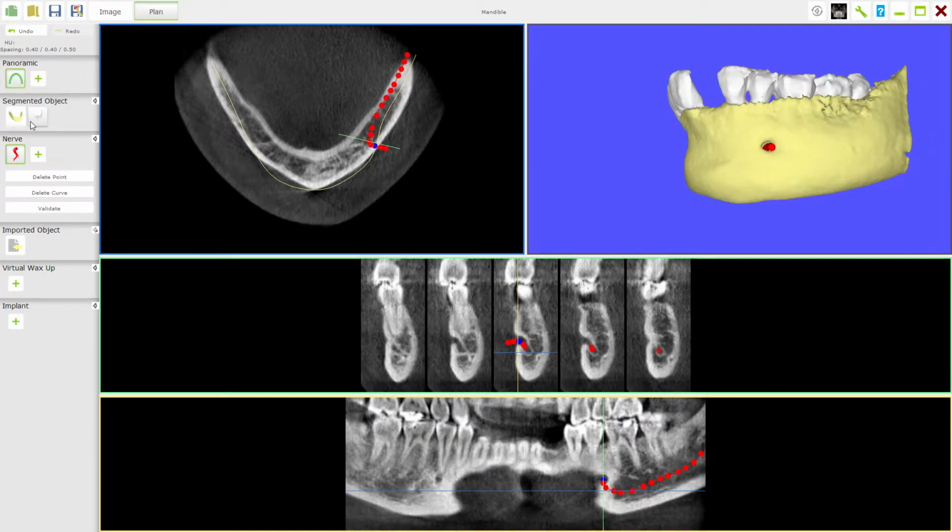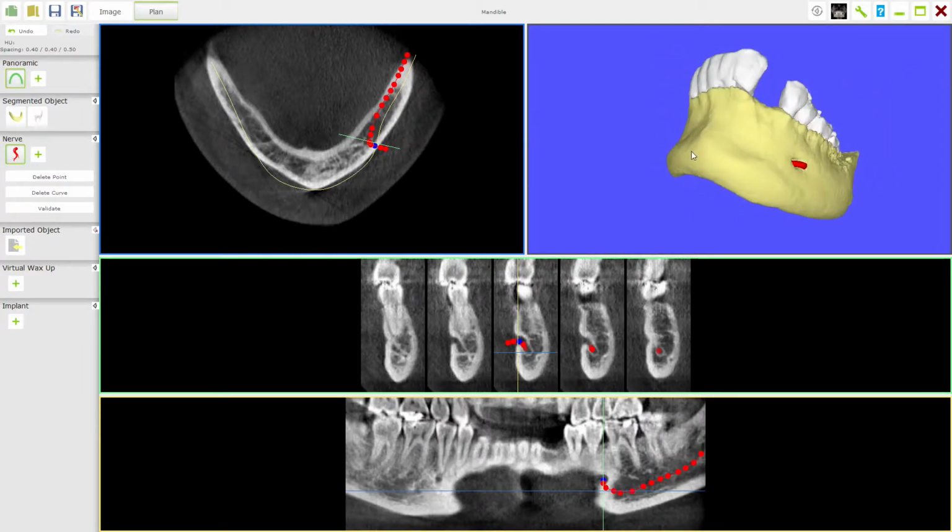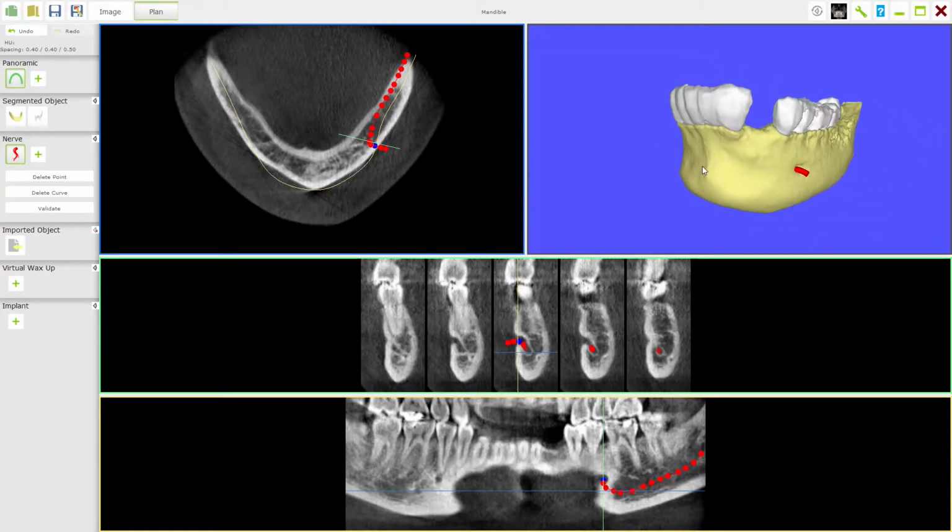Now when it comes to cone beams and reporting and radiography, when you get a report produced by a radiologist, they're not particularly bothered with these 3D views. For diagnostic reasons, they always work from these 3 views, but when it comes to planning as an implant dentist, we use this view a lot more, especially when it comes to seeing how the implant comes out.